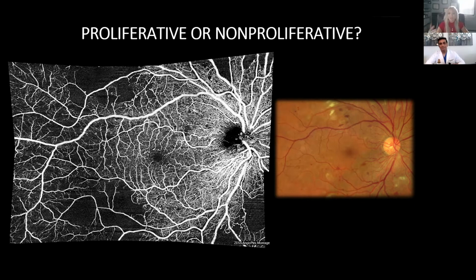So I think the rest of those patients where it's predominantly peripheral diabetic retinopathy, it just signifies to you that, hey, this really is a thing, and this patient's more likely to progress, which I'm going to cover in a case here later on. But when you have predominantly peripheral diabetic retinopathy, you've got to watch those patients more closely. I put the follow-up a little bit tighter, knowing that they're at increased risk.